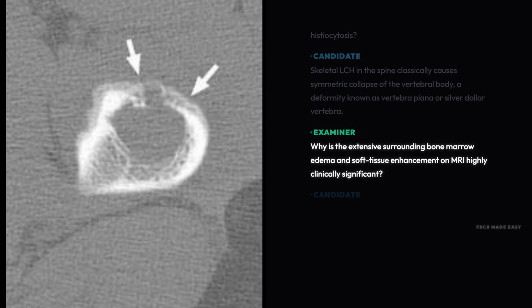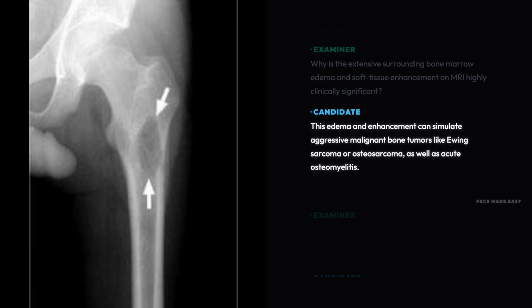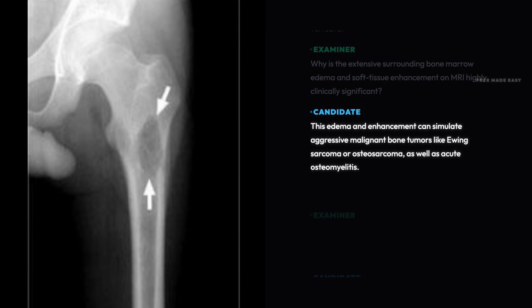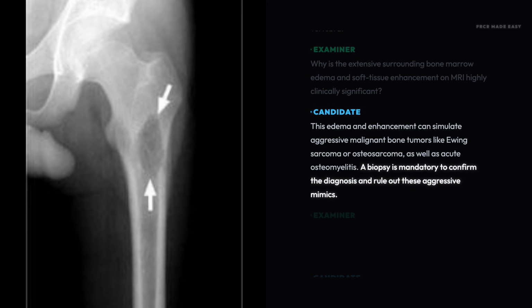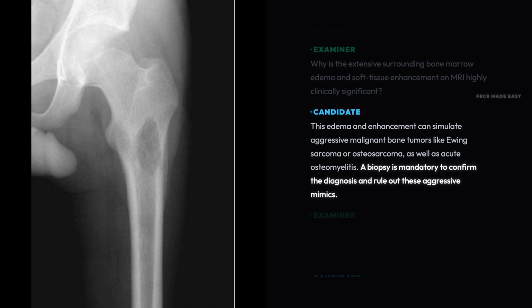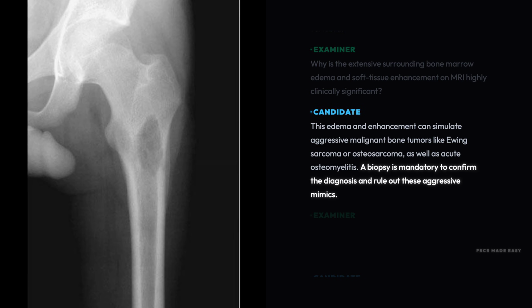clinically significant? This edema and enhancement can simulate aggressive malignant bone tumors like Ewing sarcoma or osteosarcoma, as well as acute osteomyelitis. A biopsy is mandatory to confirm the diagnosis and rule out these aggressive mimics.